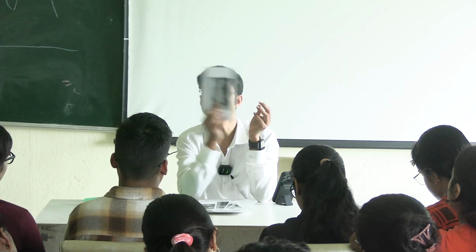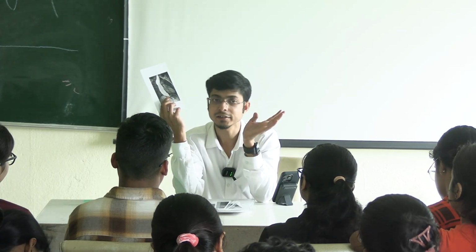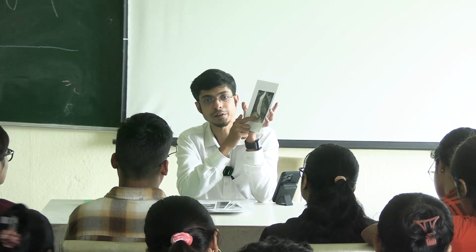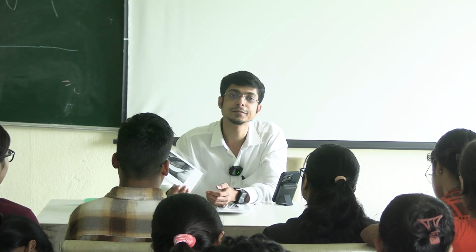So what is this appearance called? Rat tail or bird beak's appearance. Both are correct. Okay. So it's a bird beak's appearance at the lower end of the esophagus. So now what is the cause of Achalasia cardia?